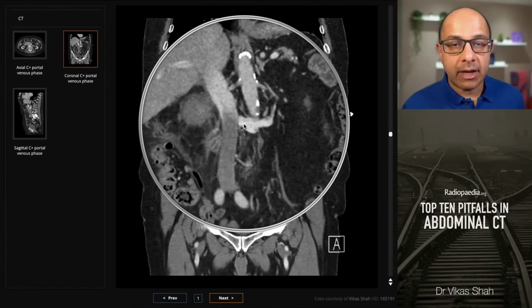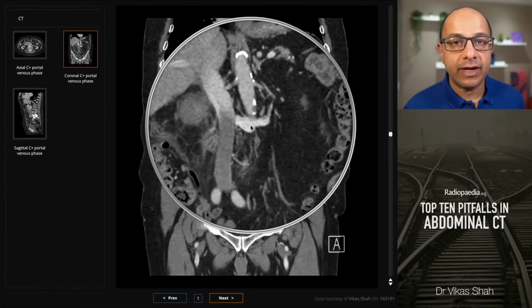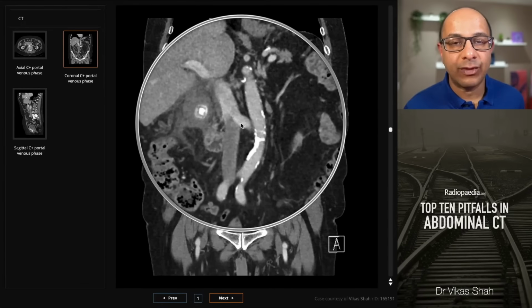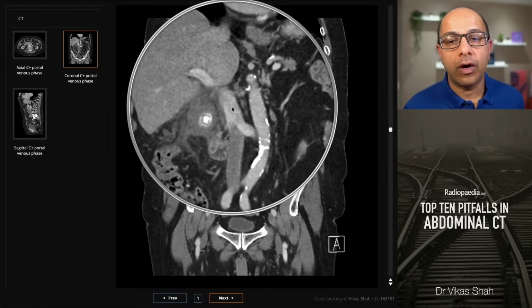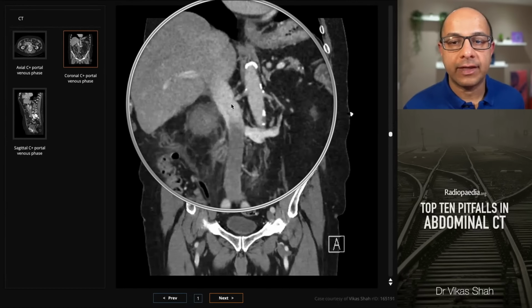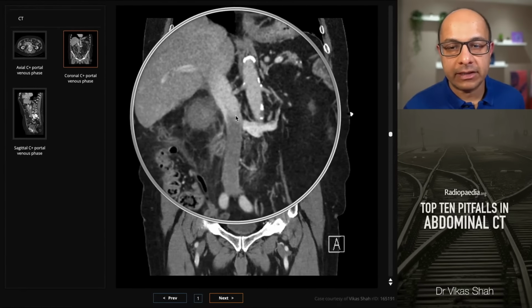The blood that's coming from the lower limbs has not yet been opacified and therefore has this low density. But the blood that's coming in to the renal veins from the kidneys has got contrast within it. It's mixing with the unopacified blood, and therefore you then get this column of higher density blood in the more upper portion, the more cranial portion of the inferior vena cava. And there is in fact a little bit of mixing and swirling here rather than being a definite cutoff.